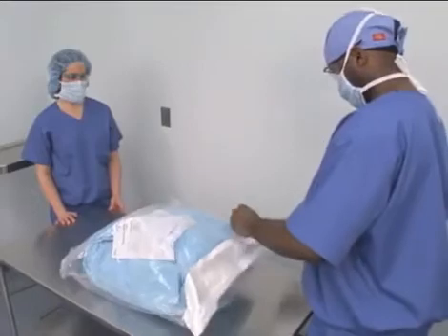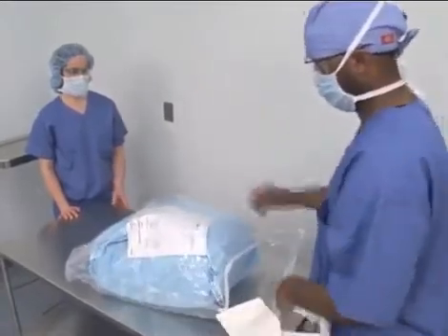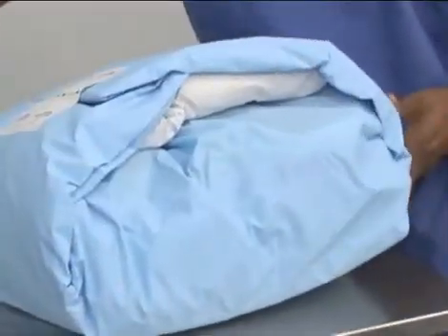with new packs. To open the large pack, which is positioned on the back table, center the pack on the table and orient it so the long ends of the outside drape line up with the long end of the table. If the pack is very large and has been square wrapped, the recommended practice is to move around the package rather than reaching across.